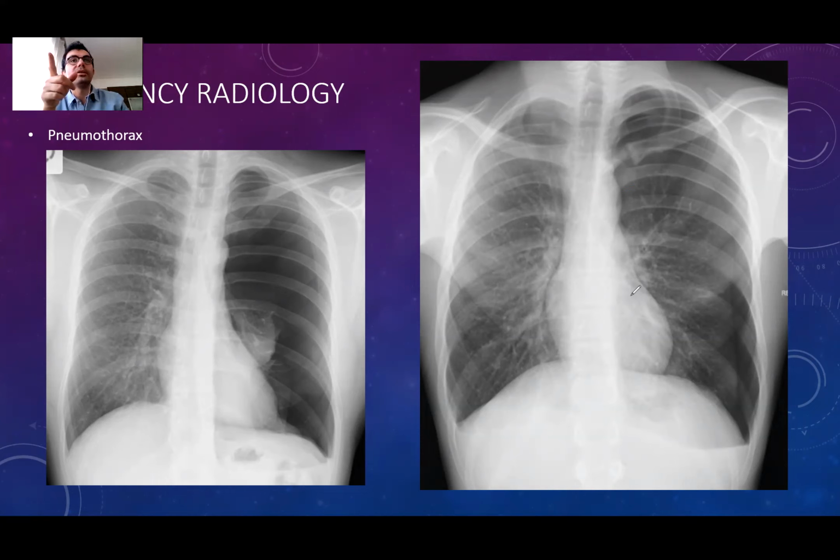What can you do for the patient on the right? Needle. Yeah, needle, right? Just a small needle. Small needle can solve all the problems. Just pierce some needle and leave it there.